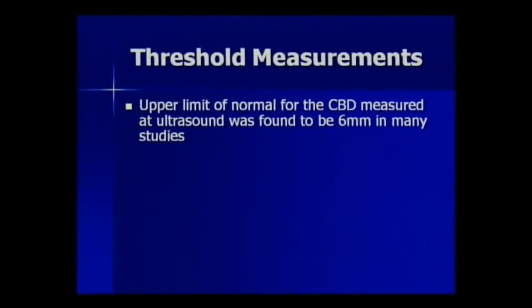So threshold measurements that we typically use, the upper limit of normal was found to be 6 millimeters in many studies.